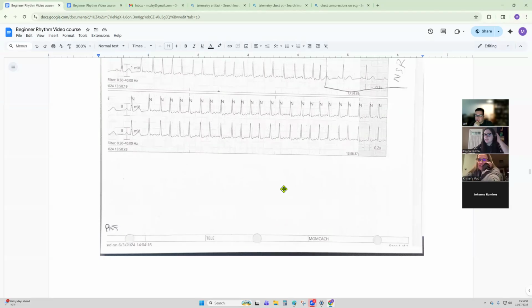I think I'm good. You would tell the nurse if they're in AFib in any way? Absolutely. If you see this and say they just had a short run of AFib, if you want to keep it simple, say they just had a short run of AFib that was 4 minutes long, and they're back to normal sinus. Or they just converted, and then they convert back. As soon as you hang up the phone, you have to call them back. Just keep communicating with the nurse.